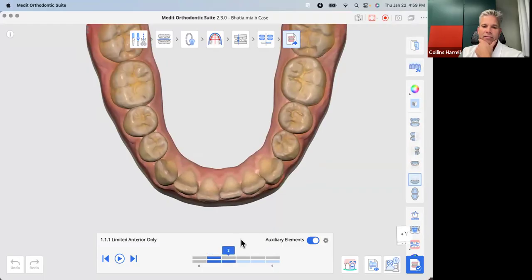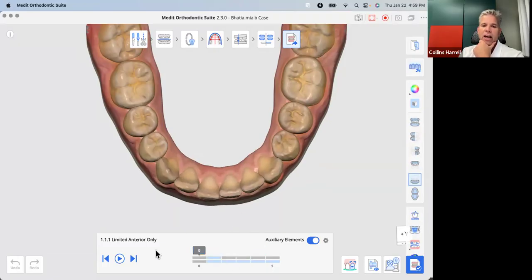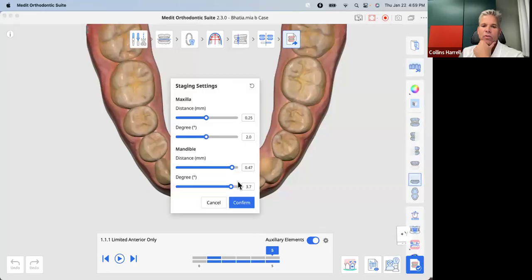And if I want that, then I can go ahead and order it, and it's going to take me through that. I don't really have control over, okay, I want this tooth to move at stage 2, and I want this one to move at stage 3. I only really have control over the final positions and how quickly we're moving the teeth to get there. Here you can see I've dialed up the speed quite a bit to get a few number of aligner stages.